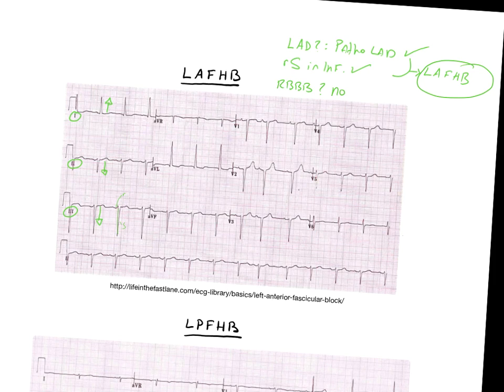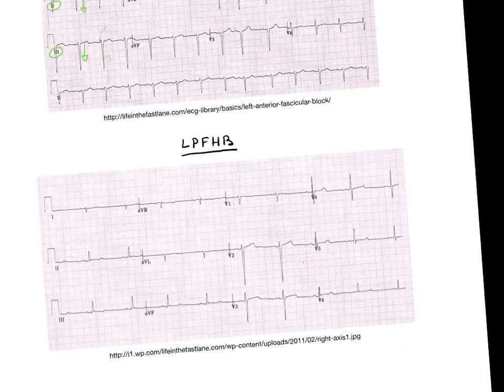How crazy is that? A couple weeks ago, you guys probably would have looked at this and said that's a normal sinus rhythm. What if they're obese, anything else? Yeah, if you can strongly attribute that. But in this case, because you have LAD and because you have the little r, big S, there's definitely more evidence pointing toward a fascicular hemiblock there. You guys go with that? Okay, well let's try it again here.